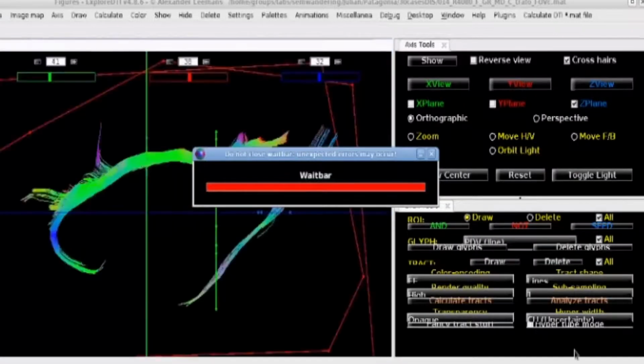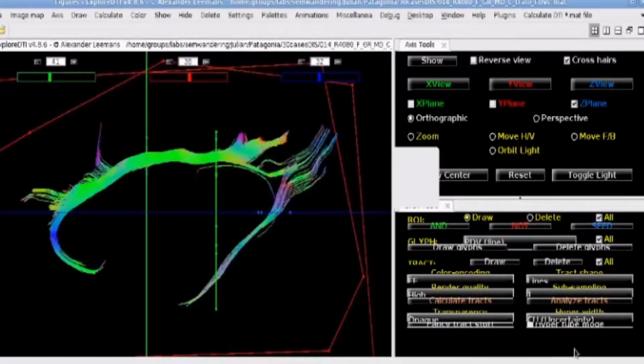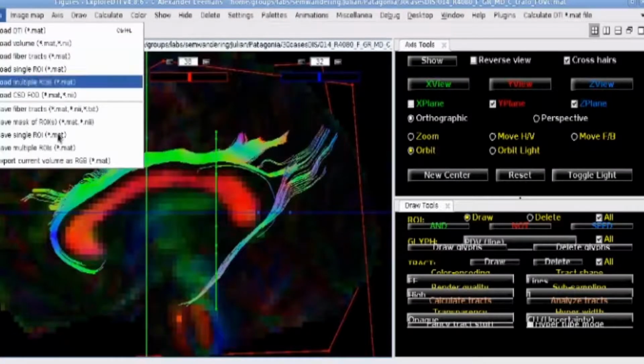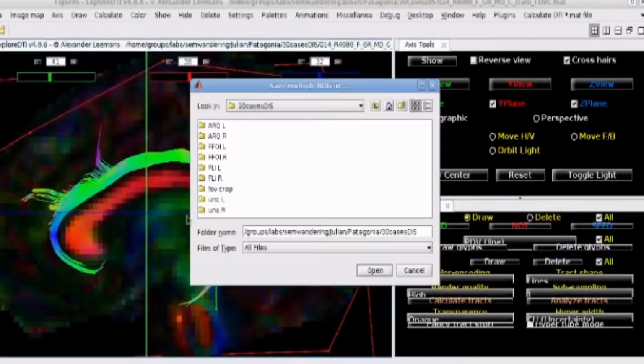The cingulum, we can capture the anterior part, the body of the cingulum, and the descending part to the temporal lobe with one dissection. And it's normal that the fractional anisotropy between the medial, the body, and the descending fibers are scattered.